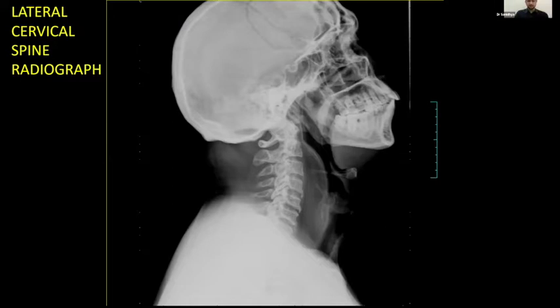But we need cross-sectional imaging. So what else can be darker than the soft tissue? One can be fat, then? See, only two structures are darker than soft tissue. Air can be there, but it doesn't look like that. Only two structures, so either it has to be fat or air. Compared to air, it is not as dark. Yes, sir. As compared to the pharynx, it's less. So then still it is possible if there is a mixture of air and soft tissue. Okay, so that's what you have to explain.